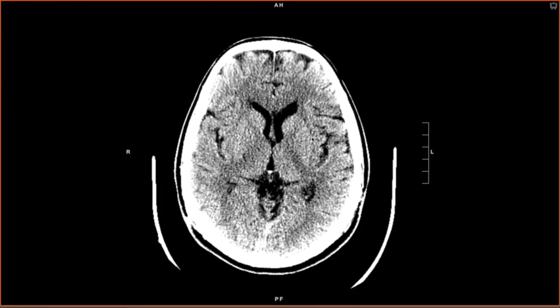And this slice right here is going to be very important, and I want you to burn it into your brains. Okay? These are the deep gray matter structures that you're going to look for when you're looking for stroke on any CT head. This here is the caudate, or the head of the caudate. This is the putamen and the globus pallidus, which is a little bit more inconspicuous here. This here is the thalamus.